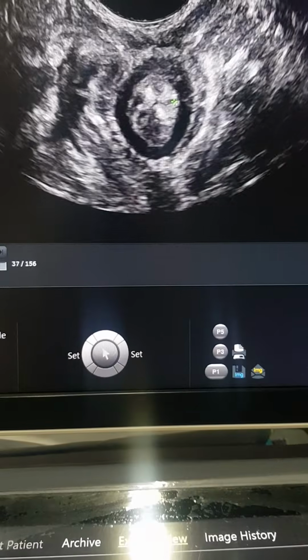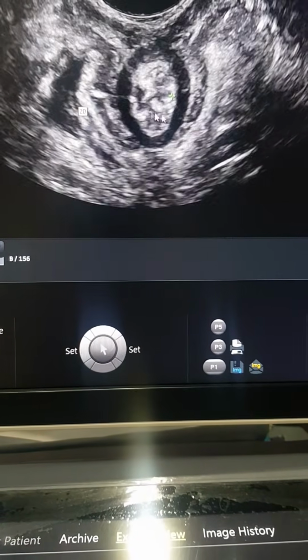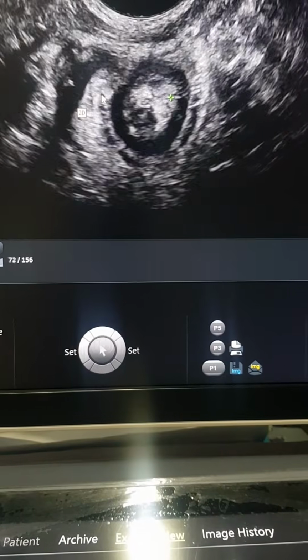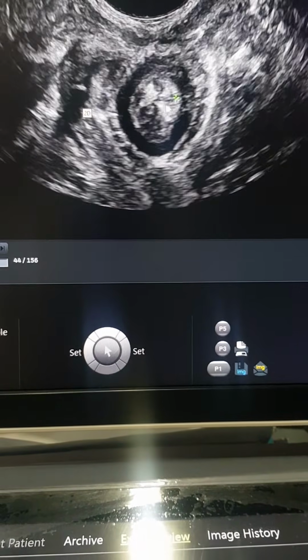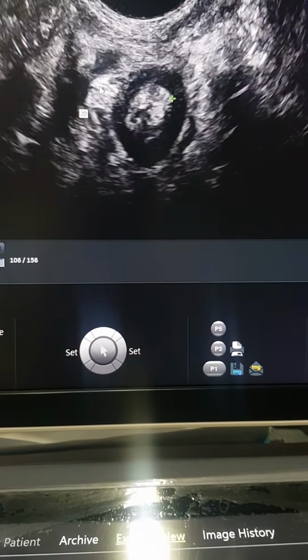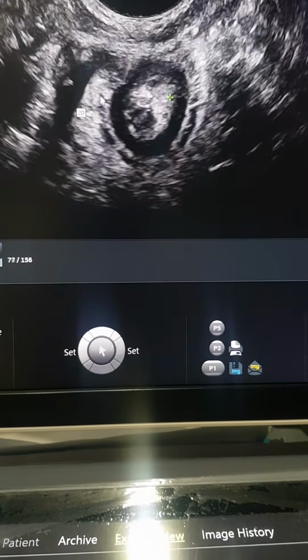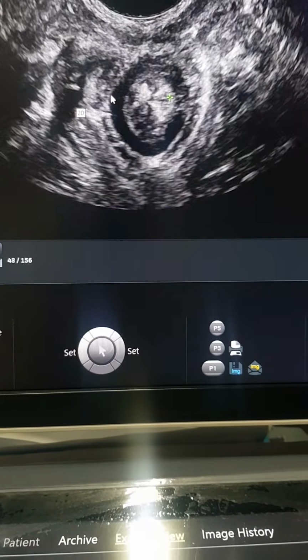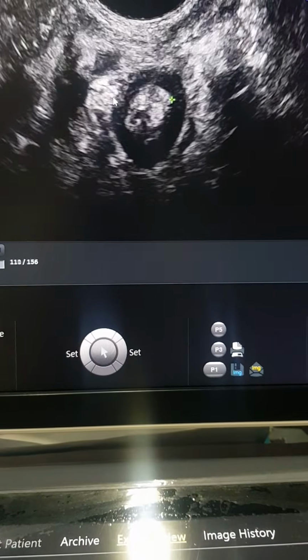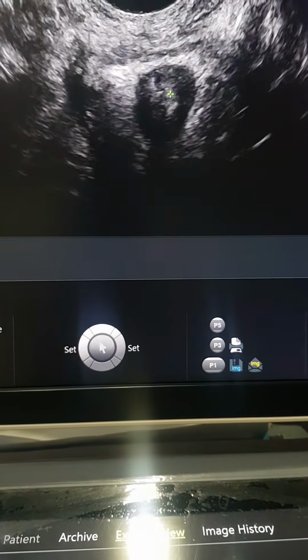This is a cine showing the presence of the ischioanal abscess here. That's the anal canal, and you can see that's the medicated thread going from the anal canal through the intersphincteric space into the ischioanal abscess. So that's the cine showing the entire internal opening, transsphincteric fistula, and the thread in the right ischioanal abscess.